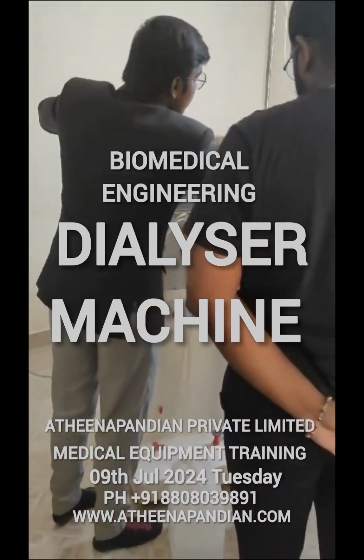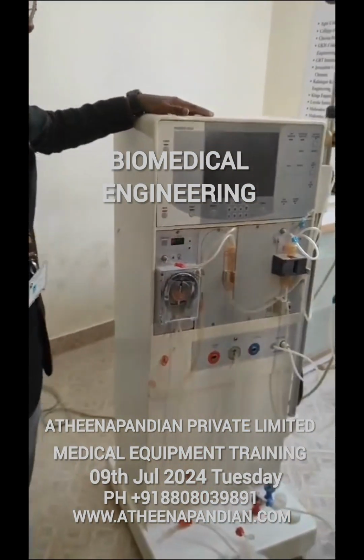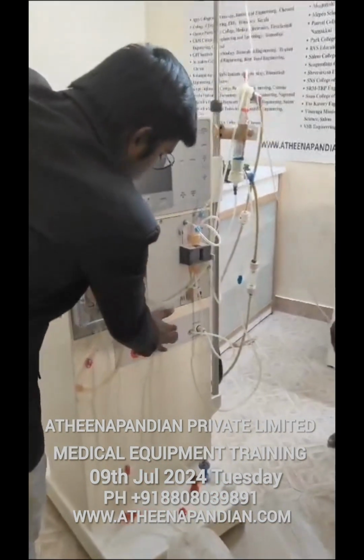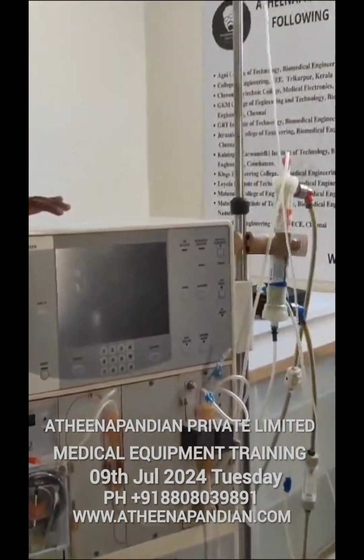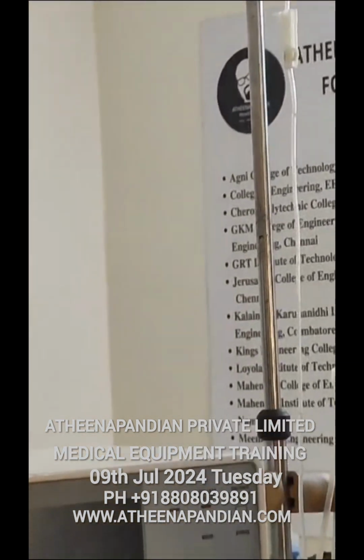Next part will be fully having the small fibers. We know already the artificial dialyzer is there. So here is the area you need to know, the two parts. One is for acid, another is for base. So what is the purpose of these two solutions? Balance. Yeah, for the balance. That is the major purpose.